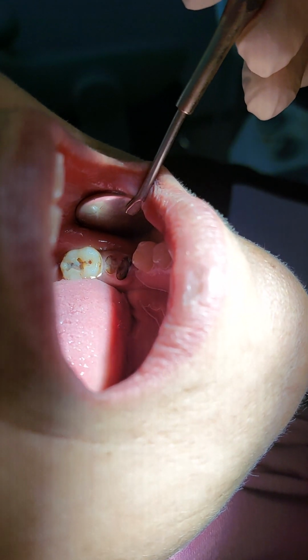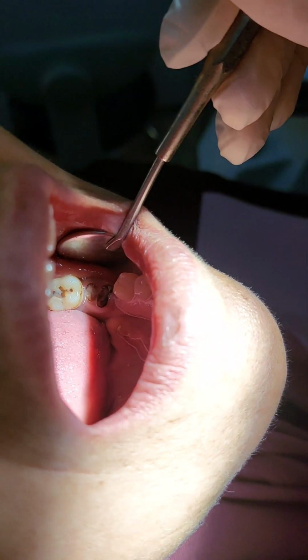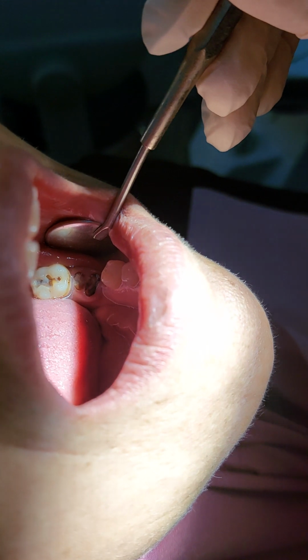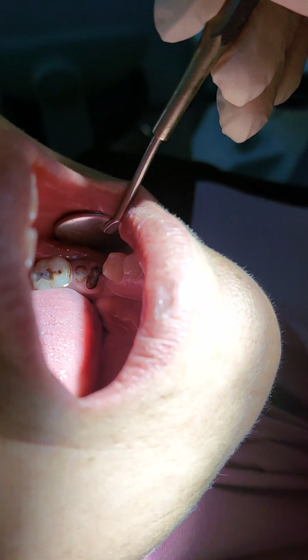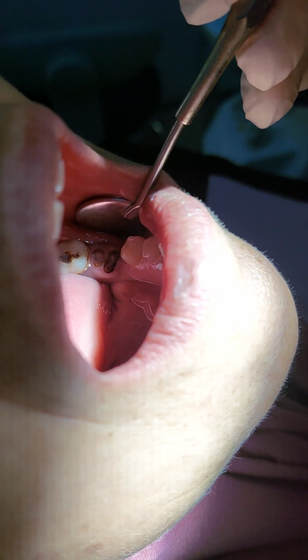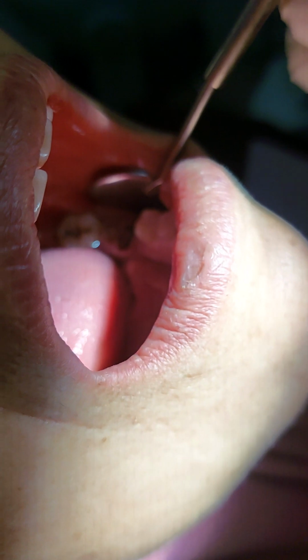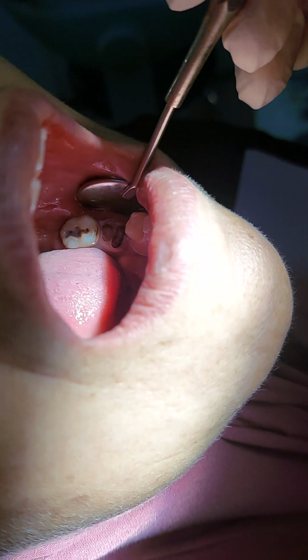The 7 is not there at the moment. The second molar is only roots. But you can see the area of bone deficiency, and you can see the 5 tilted distally, even rotated as well. Okay, that was a very early extraction of the 6. So what you see as roots is the 7, and what you see as the final tooth is the wisdom tooth.